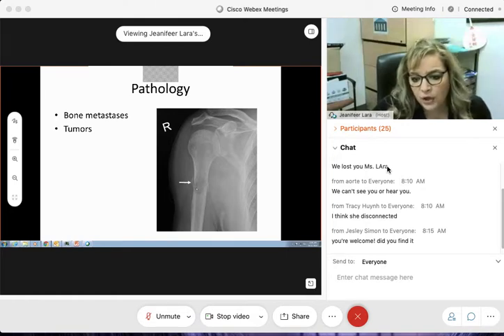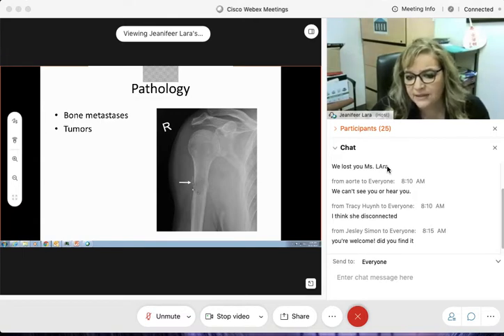We have a tumor, and so what is happening? It looks like it's a fracture. Thank you, Duan. It looks like it's a fracture. Can everyone see? It's kind of hazy because I've enlarged it. But can you see that there is a brightness change on this bone? When you look at the defined lines of the upper humerus versus the shaft of the lower humerus, we see a change, a discoloration, indicating something is there. The x-rays interacted differently here than here and here. Make sense?